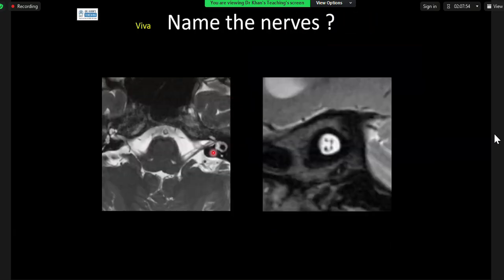Now, with that concept is MR anatomy. This is a CISS axial and a CISS sagittal oblique view of the temporal bone, where we can see four nerves here, four nerves. This is the cerebellum, this is posterior, this is anterior. So we can see four nerves, one, two, three, four. And one of my registrars, years ago, got in her viva, the examiner opened the case on a sagittal oblique like this. So if you don't have this idea, you will be absolutely lost.